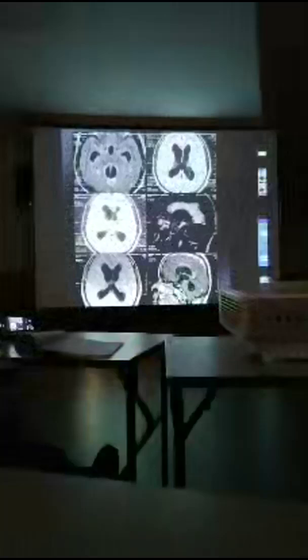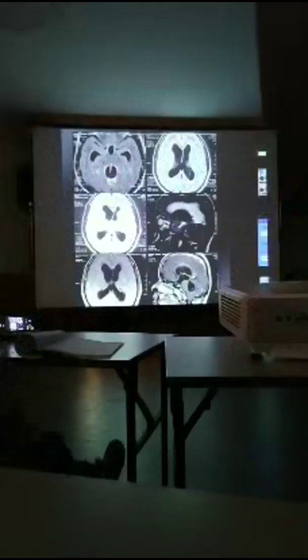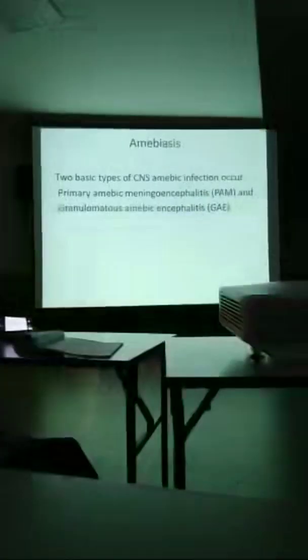The presentation may be encephalitis. You can see the multiple lesions, extensive edema, they may manifest as encephalitis, cysticercosis encephalitis. Intraventricular cysticercosis also you should think of. This patient presenting with acute hydrocephalus, you can see the fourth ventricular cysticercosis, you can see the lateral ventricular cysticercosis presenting as a sudden onset hydrocephalus.